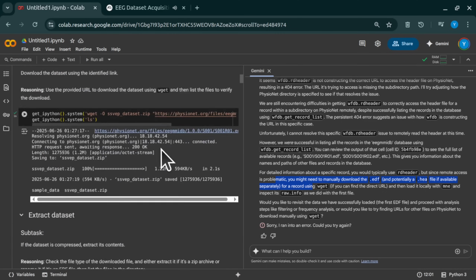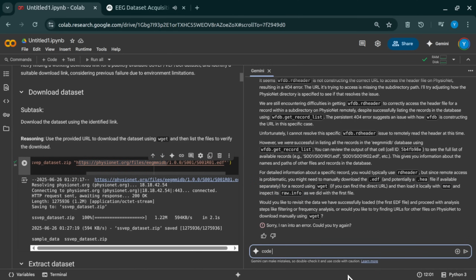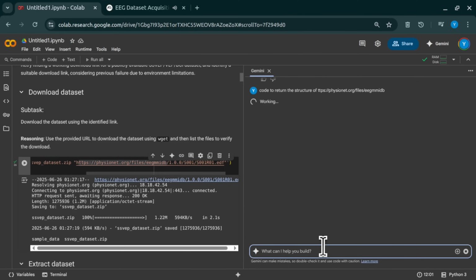Okay, so we've got the data loaded. We know the basic specs: channels, sample rate, duration. How do we start to see this? How do you visualize raw brain signals? Well, the most direct way, especially with MNE, is just using its built-in plotting function. We use raw.plot. And what did that show us? It lets you visualize the waveforms directly. We plotted, I think, 5 channels over a 10-second window. And boom, that's where you see the brain waves, those squiggly lines going across time. It makes the numbers tangible. Right, you see the ups and downs, the rhythms.